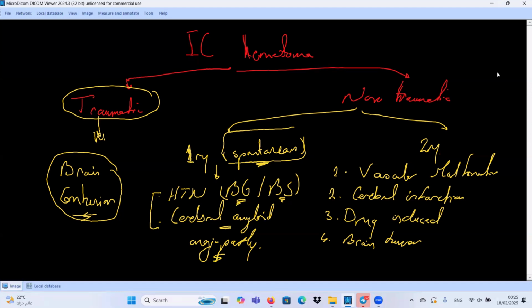So the message here: once we have an intracerebral hematoma in a young adult patient, we should follow up this hematoma after resolution to see the underlying cause. Maybe underlying AVM, maybe not. So we need to search for this cause.